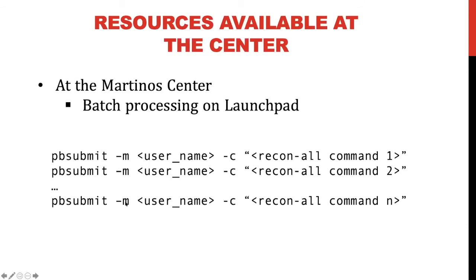You would just give it the pbsubmit command, and then your username, and then the recon-all command that you would use. It's useful in that it's going to process it on Launchpad and not on your local computer. So it's not going to take up that memory or power on your own computer, but instead it gets submitted as a ticket to Launchpad.